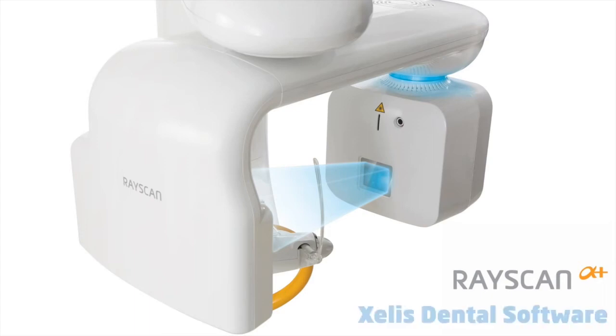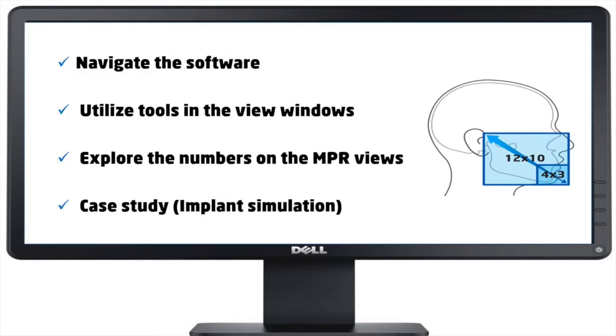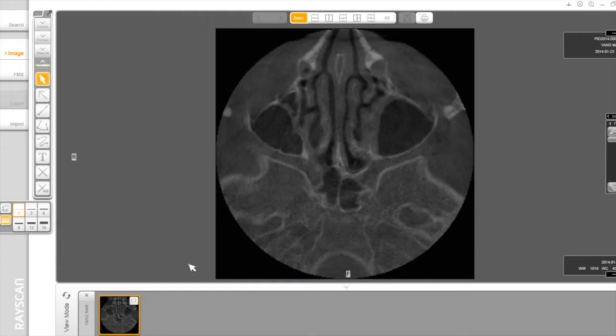Introducing Xelis Dental software. This video is designed for new employees, self-paced training, and provides how to manipulate the 3D viewer scanned from RayScan Alpha Plus. By the end of this video, you should be able to navigate the software, utilize tools in the view windows, explore the numbers on the MPR views.